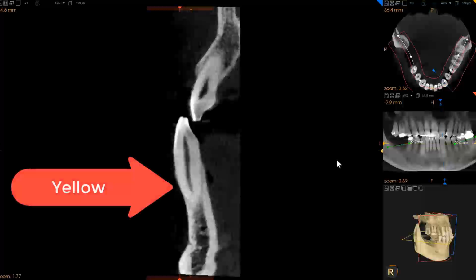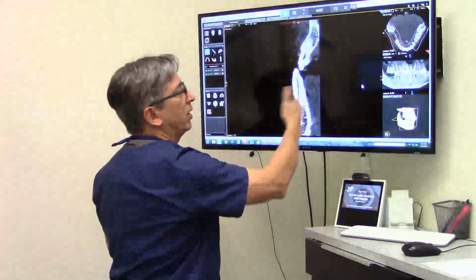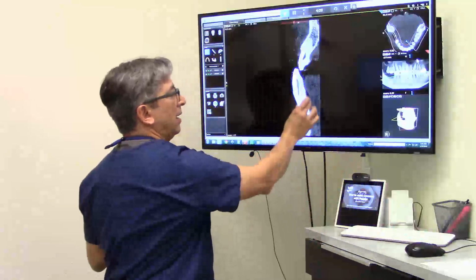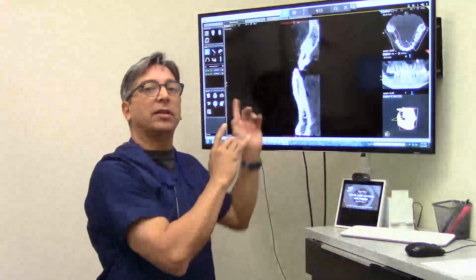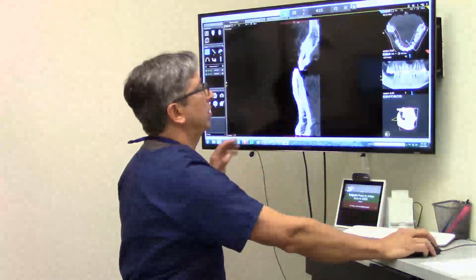And it's a yellow because the other part is so green. This now becomes more yellow. So I feel like you've got to play a little bit with that, even though you may not see it that clearly on the CT here. I bet this patient actually has more bone, and certainly the facial plate here.